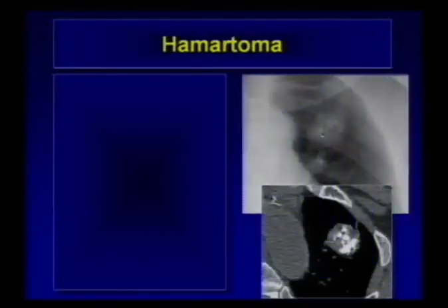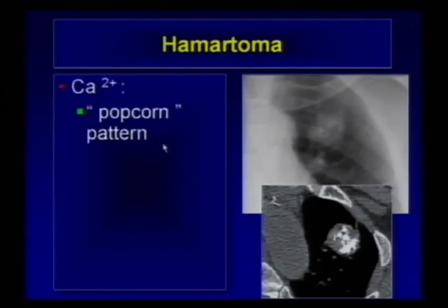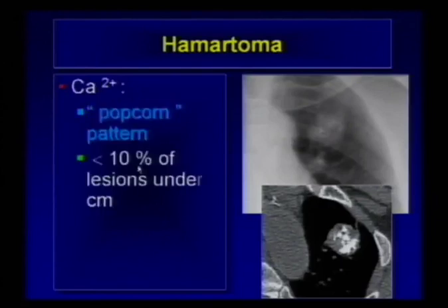Here's pretty typical chondroid pattern right here. The AFIP people call this chondroid lesion, like when you see it in bones, same when you see it in a lung nodule, rings and arcs. I think that's pretty useful way to remember the descriptor here. Calcification is often popcorn in configuration. That's what chondroid matrix looks like.